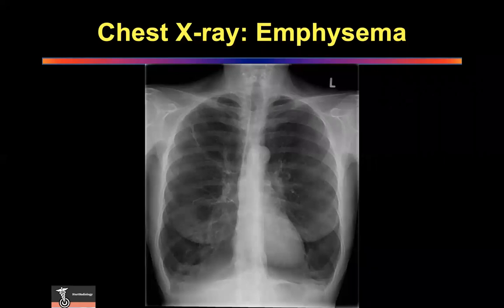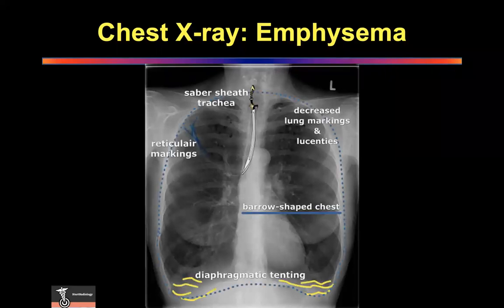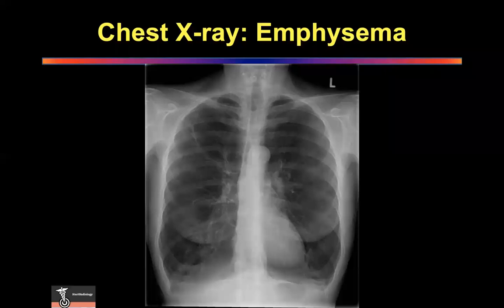Let's look at this X-ray. I've given the diagnosis on the top, I'm sorry about that. But how many pathologies can you pick up on this chest X-ray? Just examine yourself. How many pathologies can you pick up? I'm going to wait for a few seconds. Okay. How many of you got all of these? Okay, it's very important. I'm going to go back and now start looking again.